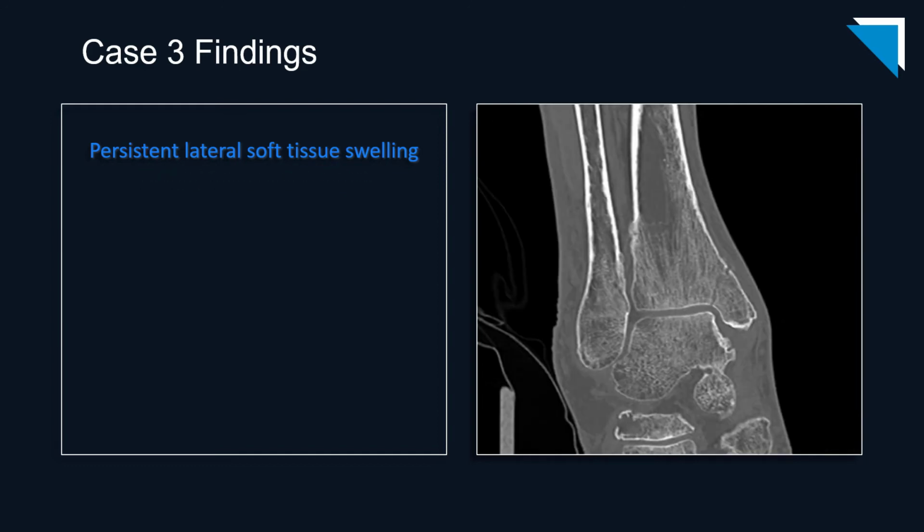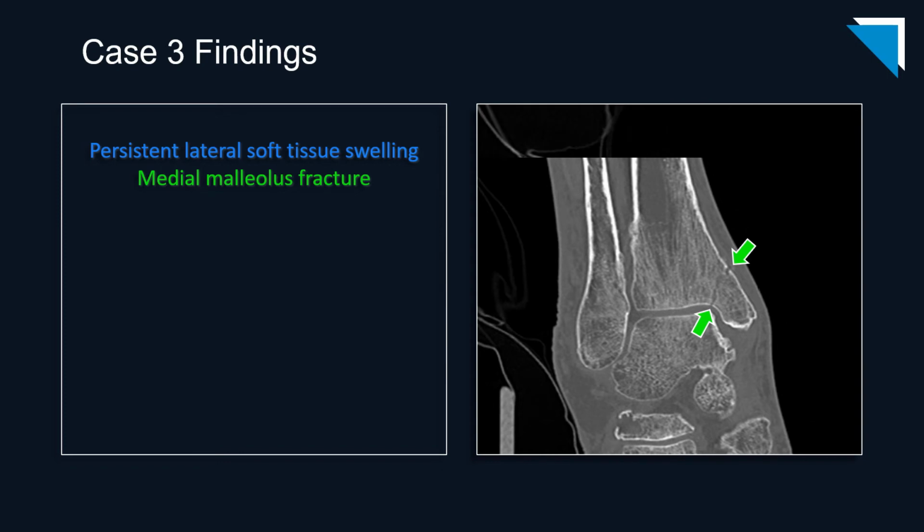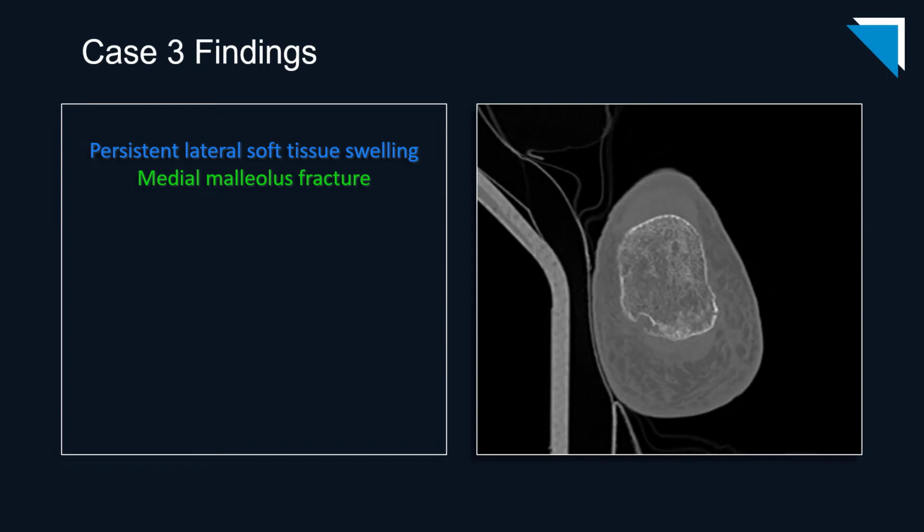The fracture is a bit more conspicuous on this coronal image, and I think perhaps you can appreciate just a little bit of cortication there at the fracture site, suggesting subacuity. Of course, we're talking about satisfaction of search today, so there's a second finding.